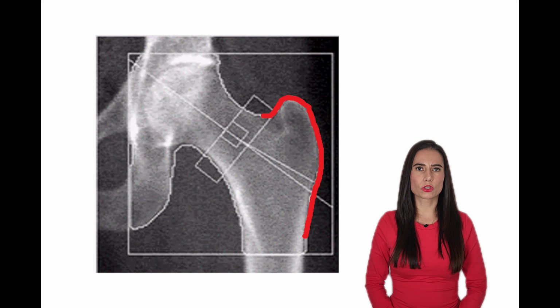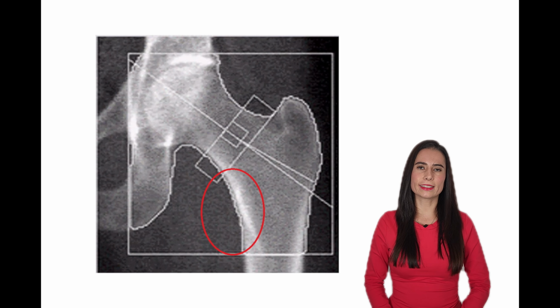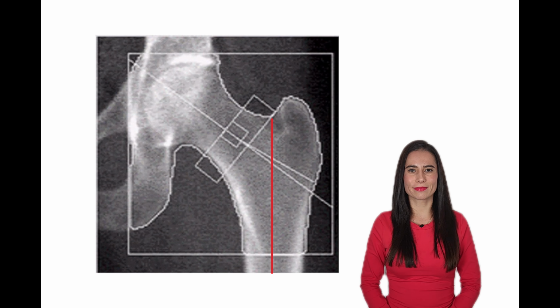The greater trochanter should be clearly visible. Part of the ischium should be visible. The entire hip joint must be represented. If the femur is rotated inward correctly, the lesser trochanter should be briefly or not visible at all. The femur diaphysis must be in a straight position.